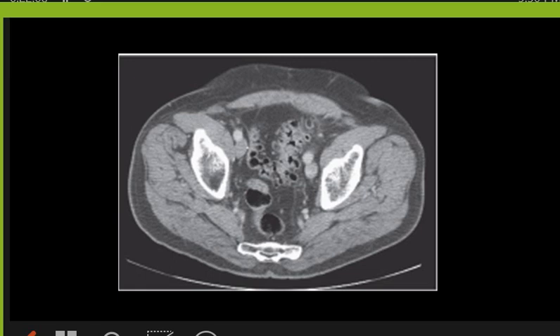Associated with an area of fat surrounding and signs of inflammation, so the picture suggests diverticulitis. You see multiple outpouchings in the sigmoid, but we don't actually see fat stranding. We don't see fat stranding in the sigmoid here, and this is only simple diverticulosis.